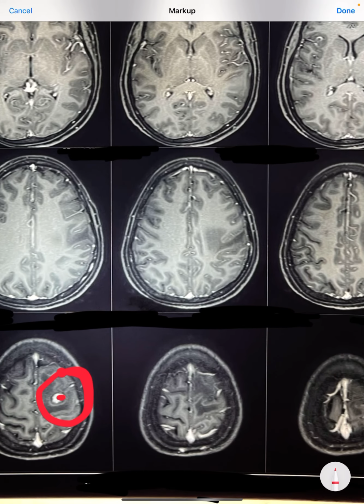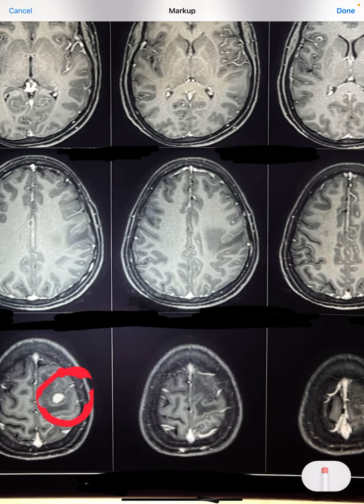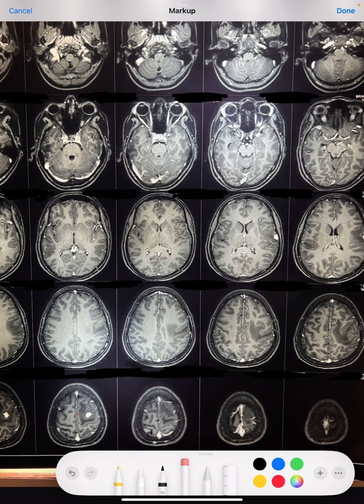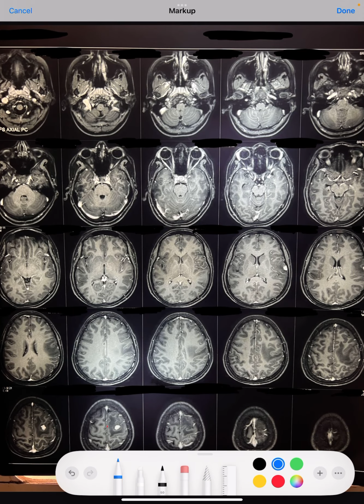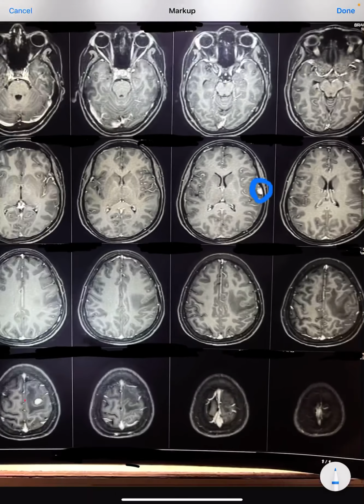And this is the second contrast enhancing ring lesion, which was not very apparent on T1. So you can see that this lesion got enhanced with contrast. That is the beauty of contrast, because it enhances the problem wherever it is.